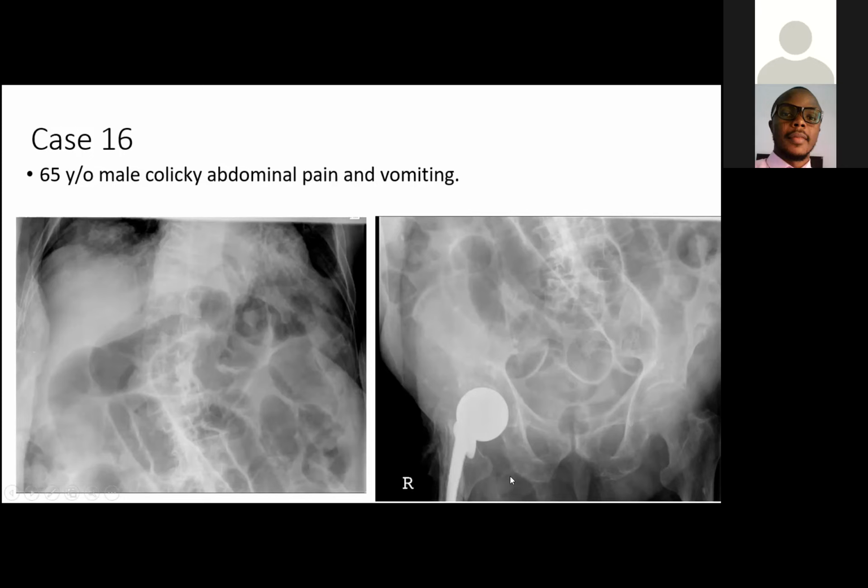Now it's difficult to tell whether it's inguinal versus femoral. Obviously, femoral is commoner in women, but certainly what you can tell from here is they've got a hernia, which is probably incarcerated and is a likely cause. Again, just because they've got a hernia and they've got small bowel obstruction doesn't mean the hernia is the cause of the obstruction. So these patients will invariably get a CT scan. CT is also very good at detecting complications such as signs of strangulation or perforation, which you may not be able to tell on a plain film.